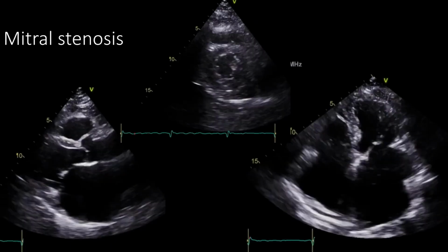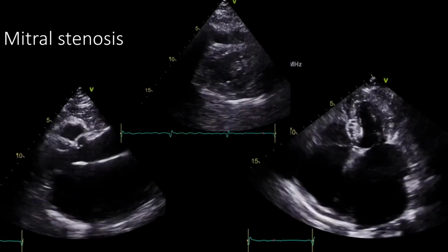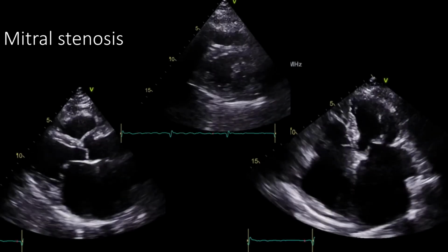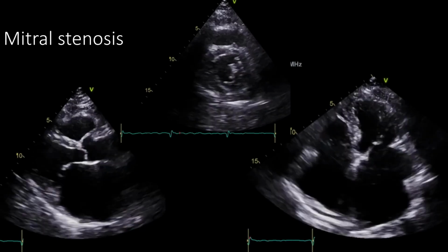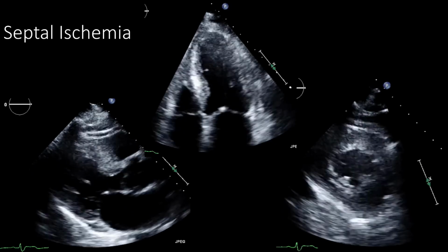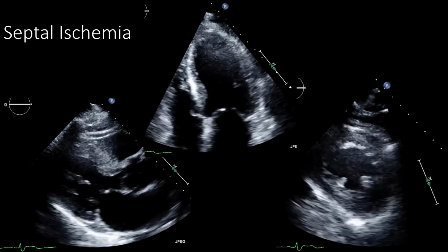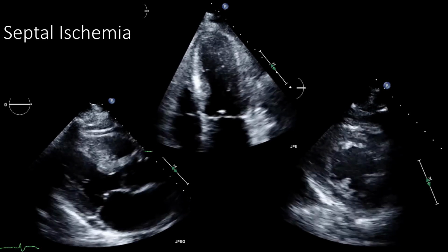Severe mitral stenosis mimics RV volume and pressure overload, with predominance of volume pattern. There is a classic diastolic dip, as RV pressure can exceed LV pressure at that point when the LV is particularly empty. This is often hard to properly notice, but is a classic reported finding. Septal ischemia may also cause some changes in motion, but it is mostly through hypokinesis and akinesis. The septum will thus look abnormal, but it often appears to shift because it is being dragged by the other walls.